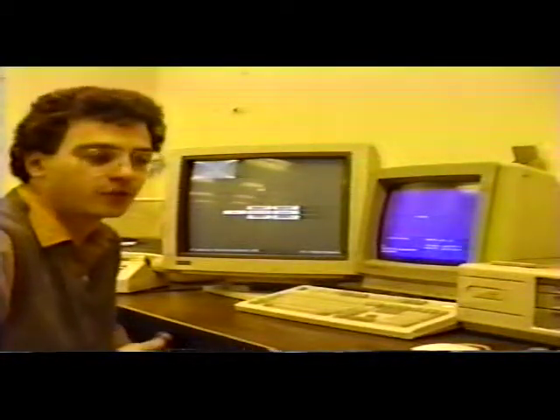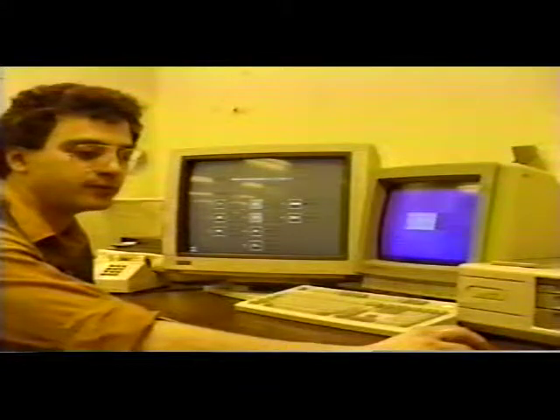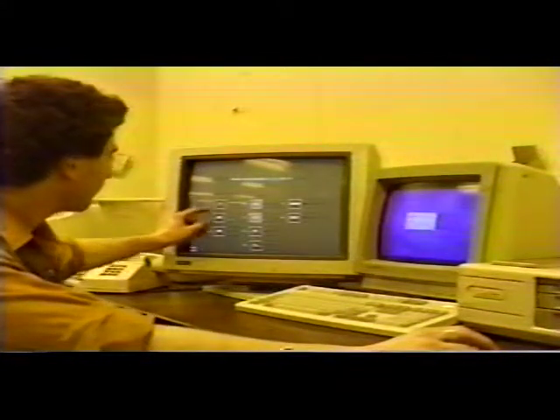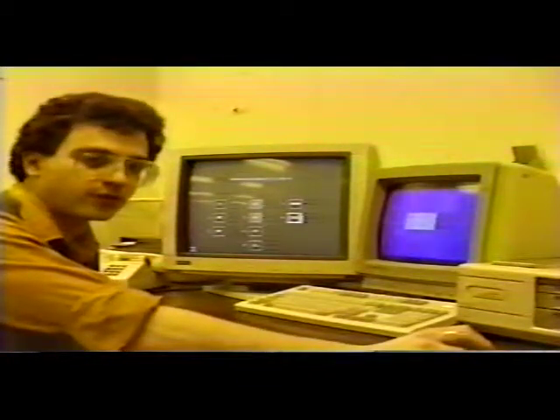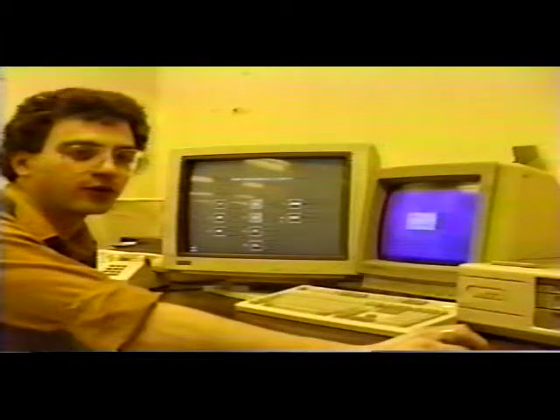Images on the card are grouped into studies, and we can view by modality. And when you click on View by Modality, you are given a list of all the different modalities that might be on the card. Ones that are in black are modalities that are present on the card. Ones that are gray are modalities which the system knows about, but which aren't present on this particular card.